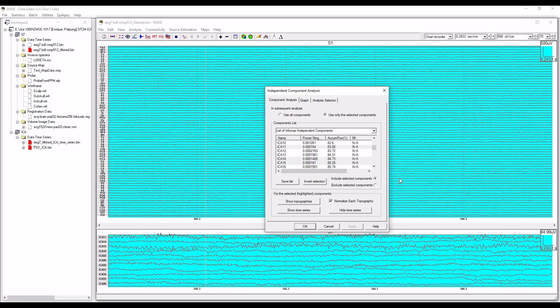So in this strategy I decided, well, let's not just exclude the artifacts, but let's go based on the ICA time series down here. So let's look at the ones that are interesting and just select those. The ones that are interesting presumably won't have artifacts in them, but they'll also filter out other things that don't have artifacts, but maybe they're not the most interesting components that you're interested in. So anyways, other strategies are possible, but let me just show you that.